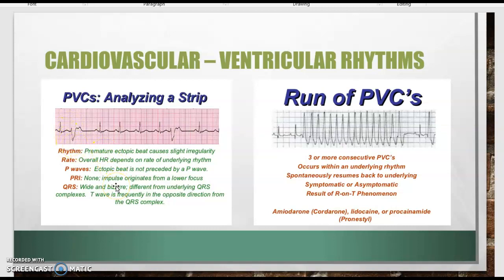PVCs are not necessarily a problem. You and I, as we are sitting here going through this lecture, we might throw a PVC here and there, and that is no big deal. We don't feel it. It's just normal. You might have one every now and then. Okay, but when we come over here, if you have 3 or more consecutive PVCs, we are going to start looking at an issue here.